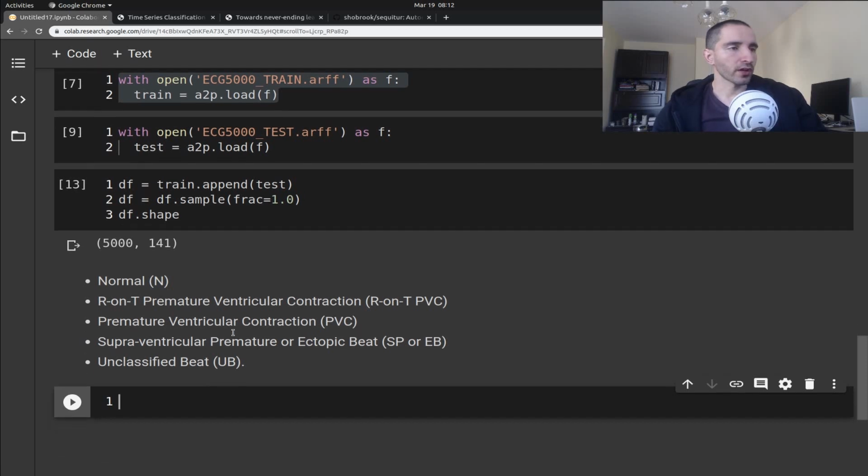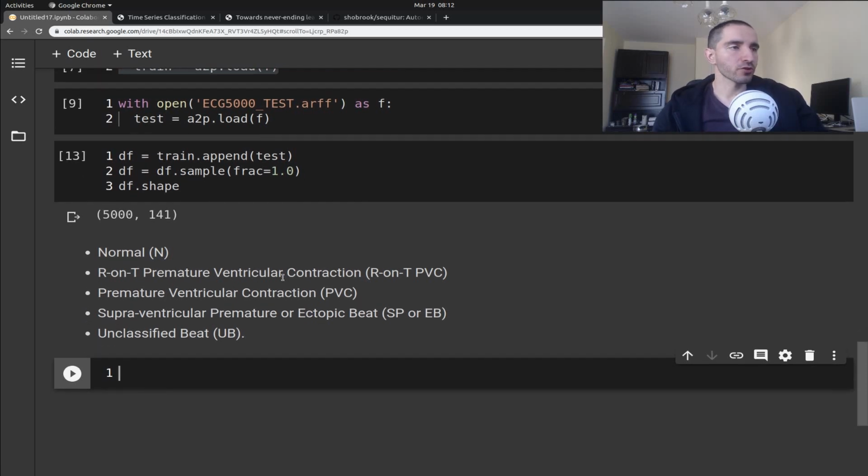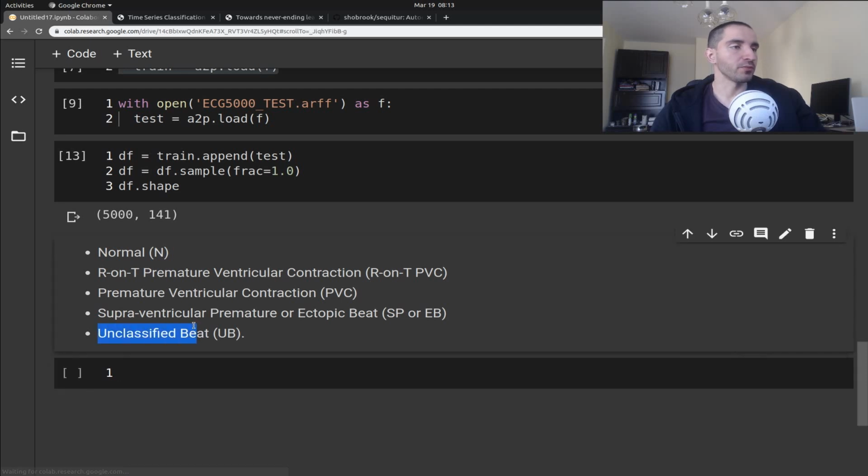All right, we have the normal class. We have premature ventricular contraction, which is an anomaly. I'm not familiar with these terms. We have premature ventricular contraction, supraventricular premature or ectopic beat, and unclassified beat.